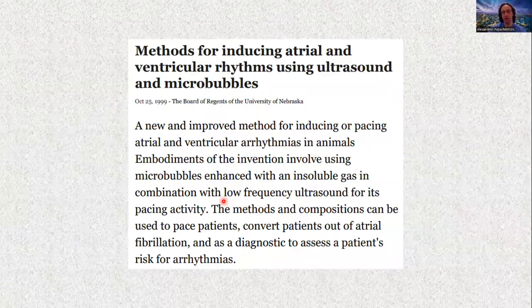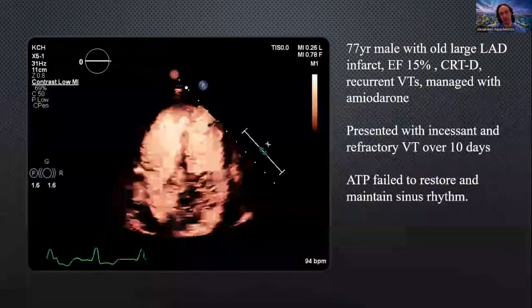This is something you need to be aware of when you use ultrasound contrast, especially when you use a flash. All the vendors have some limit in terms of the mechanical index you can use for flash imaging. It's not the maximum mechanical index that the machine can provide, but it's lower than that because the bioeffects can induce arrhythmias. And I will close with this case.